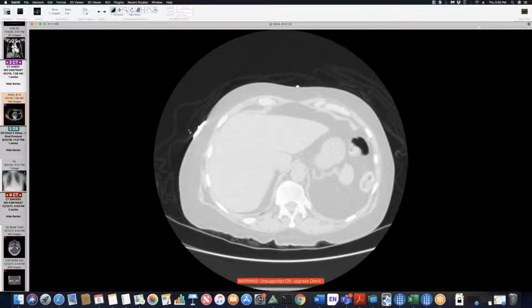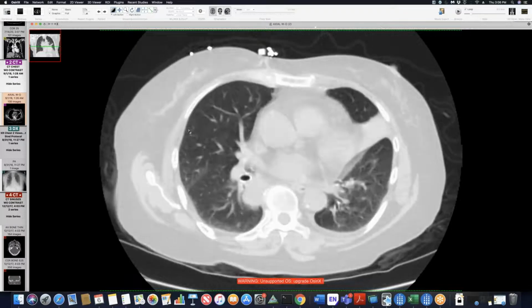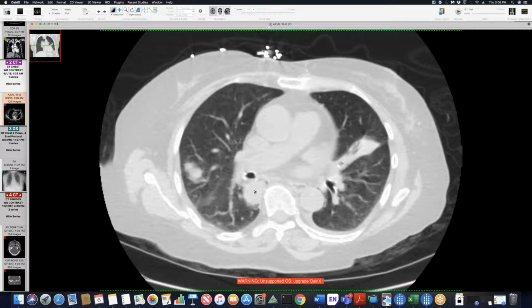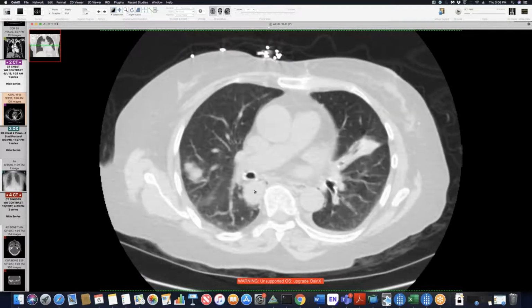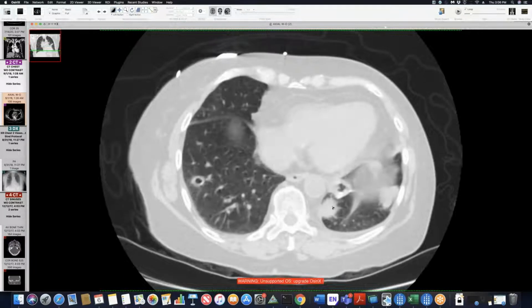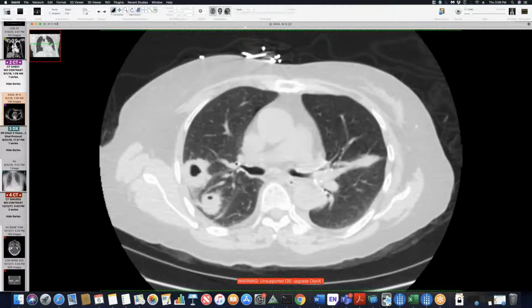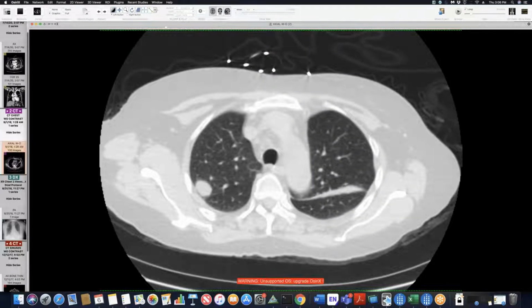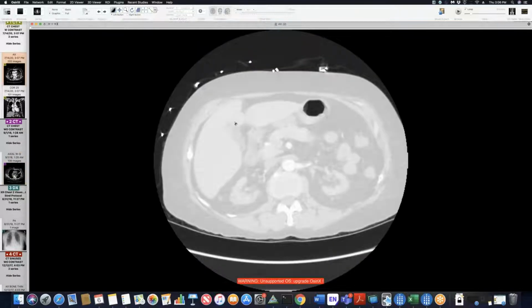And here's a CT done right after the radiograph, and these are the nodules that are easy to see in the upper lobe. Here's the nodule right against the azygoesophageal recess, and then another nodule. So as you can expect, sinus disease and cavitating nodules. This is GPA, Wegener's previously referred to, and this is the CT I looked at a few weeks ago.